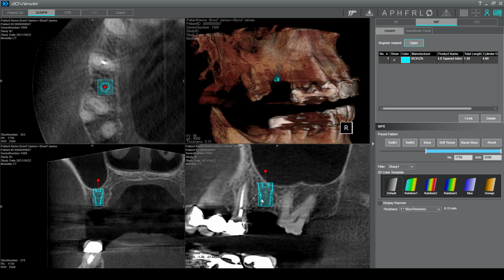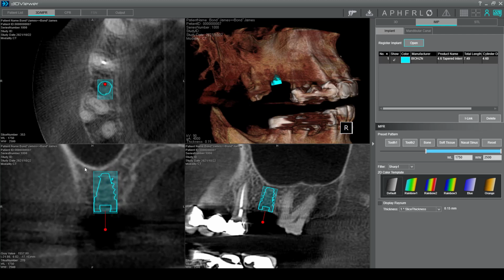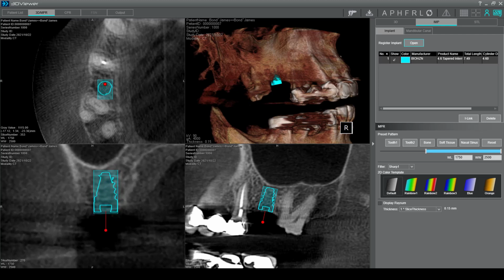Alternatively, here you can see our implant is upside down, so we're going to use the red arrow, the red ball here, and just give it a rotation, and then place it at the start here of our bone structure. I'm going to be using every single view here to make sure that it's placed accurately in the middle, and that my rotation is correct.